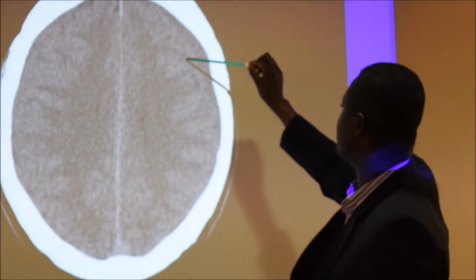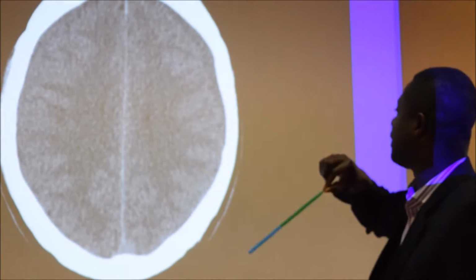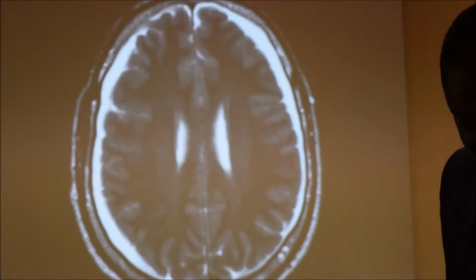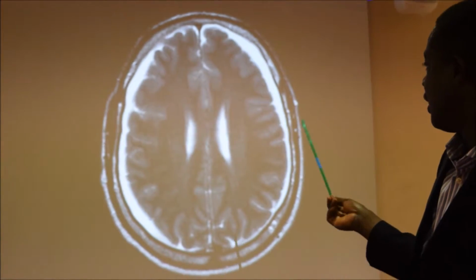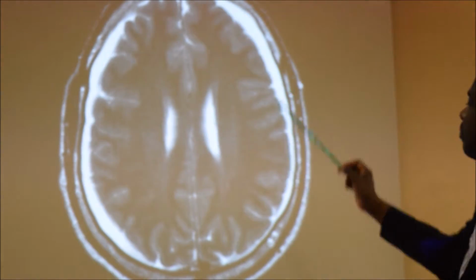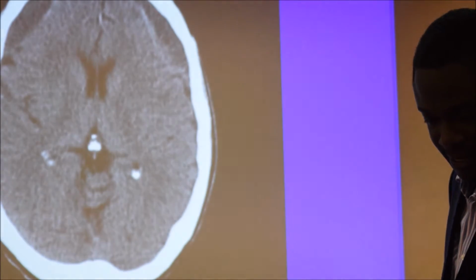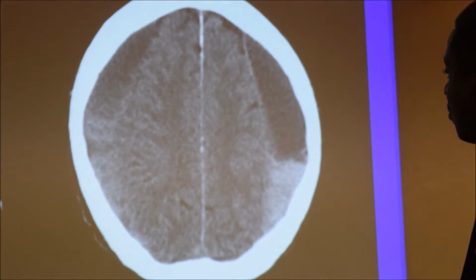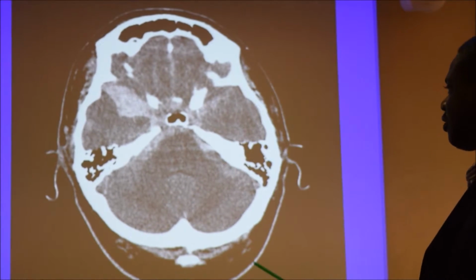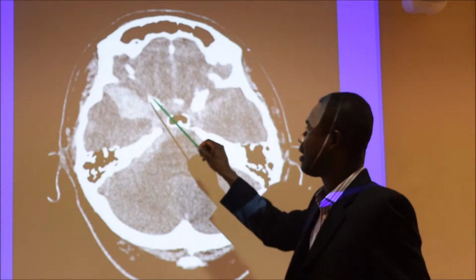It's always important to make sure that the sulci go all the way to the end of the inner table of the skull. But MRI shows it a lot better. With MRI, obviously, you're not dealing with densities, just different signal intensities. A few more examples. I'd just like to go through this quite quickly, just using this to demonstrate the densities. Now, acute fresh blood looks like that.